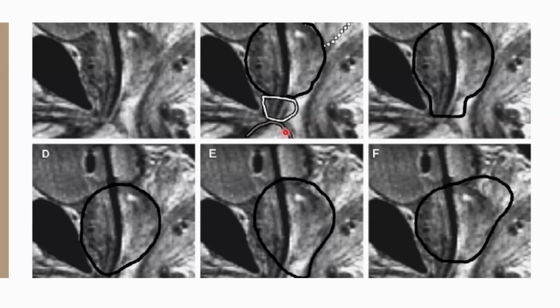Now, very often when we start contouring, when we are a little less experienced, our prostate contours can look like this in the coronal plane, in the sagittal plane. So we've contoured too much into the urogenital diaphragm, and we've kind of reached the penile bulb. When we contour like this, we are giving an unnecessary dose to the urethra in the urogenital diaphragm and increasing the risk of getting a stricture later on.